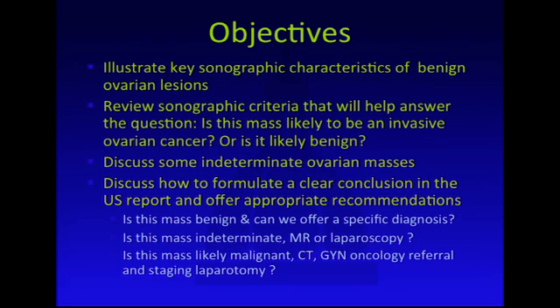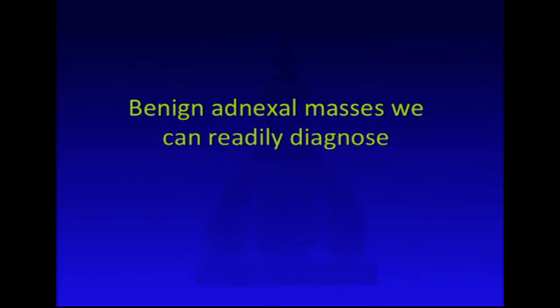Is this mass benign? Can we offer a specific diagnosis? Is this mass indeterminate, and should the patient have MR or perhaps laparoscopy? Or is this mass likely malignant, and then the patient will go on to CT and GYN oncology referral for staging laparotomy? So ultrasound will be very helpful in triaging and in the proper management of the patient.